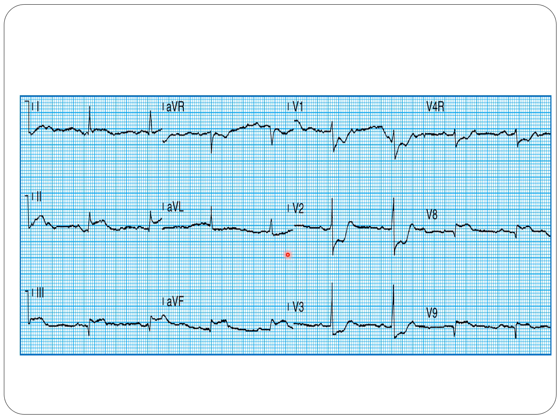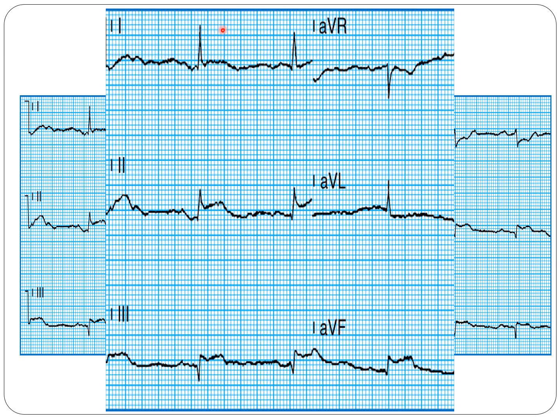Next one is rhythmic. The heart rate is slower than normal. If you count, this can be around 1, 2, 3, 4, 5, a little bit less than 5, so around 55. By looking at the P waves, I barely see any P wave. Looking at the axis first, and afterwards we can go back to another lead. Narrow QRS, lead 3 is negative, AVF is positive, so this should be between 0 and 30 degrees. So I can go for 15 degrees, for example.